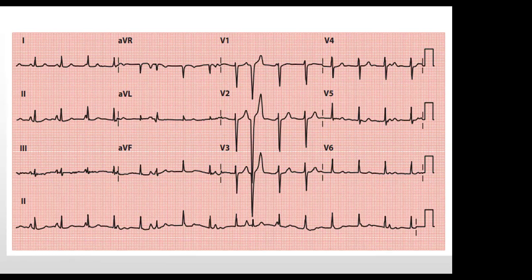And if you look at the period where you don't have P waves, you could see a notch after the QRS complex right here that looks like a P wave, which tells me this could be coming from the junction with a retrograde P wave. But again, we expect that to be inverted. Again, you're seeing something that looks like a P wave after the QRS complex. So maybe it could be the timing between the impulses conducted through the AV node and the junctional rhythm.